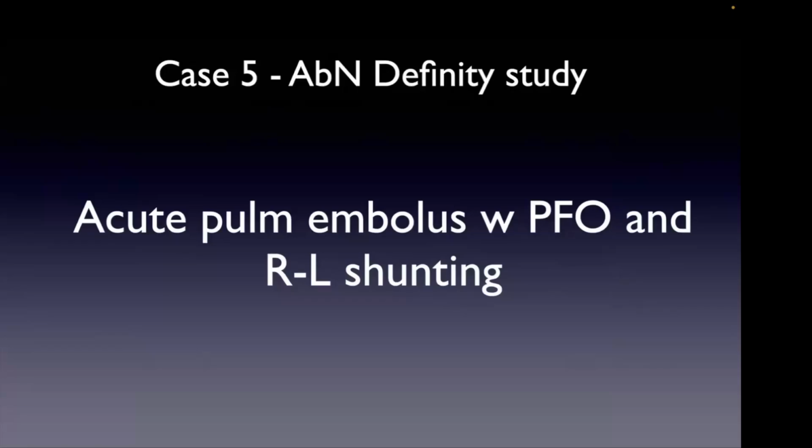So timing would matter, because you can get a 4+ shunt from transpulmonary shunting. Sometimes you'll see it streaming from the pulmonary veins. It's pretty clear, but the timing helps a little bit with regards to intra-atrial versus transpulmonary shunting. So with a really good Valsalva, it should really increase with Valsalva release. But if it's 4+, it's going to be 4+. It may not be increased that much. It's severe, so it's unlikely that you'll need a Valsalva if it's 4+. But I reserve the right to make a decision on a case by case basis.